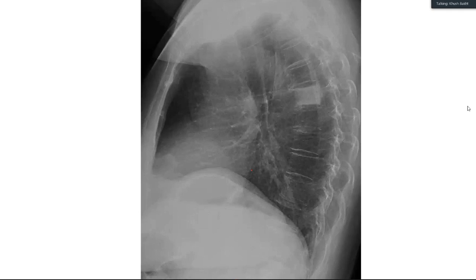Sir, there are only fused osteophytes at the level above this dense vertebra. The pedicles are intact. The posterior spinous processes are normal. So there is no lysis or additional sclerotic lesion. I'll take the case from here.